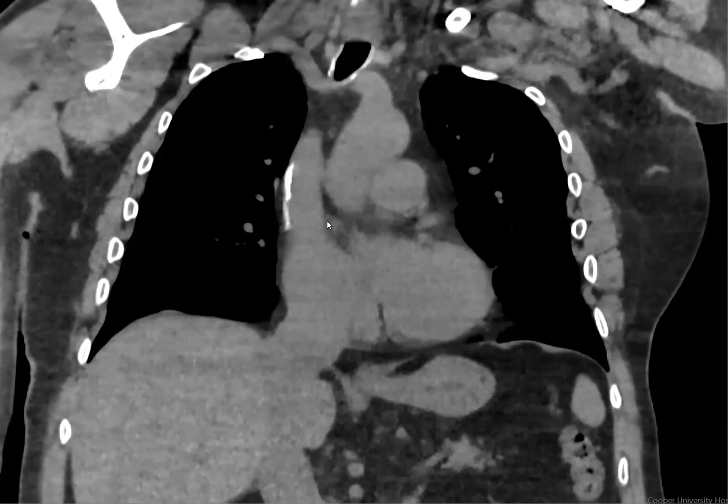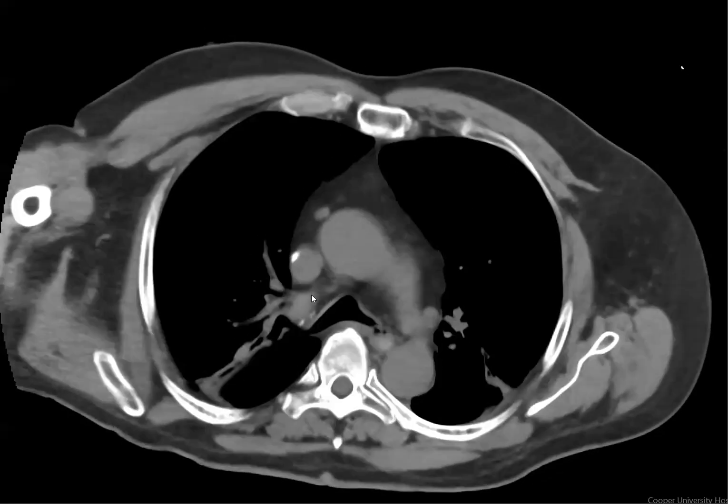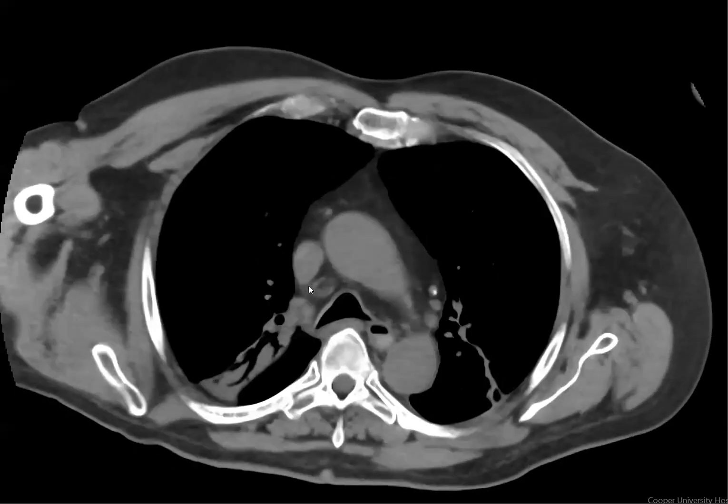And usually it is more common in patients who are diabetic because they tend to have a higher degree of dystrophic calcification. So this basically is a fibrin sheath calcification that is present, and there is no retained catheter there.